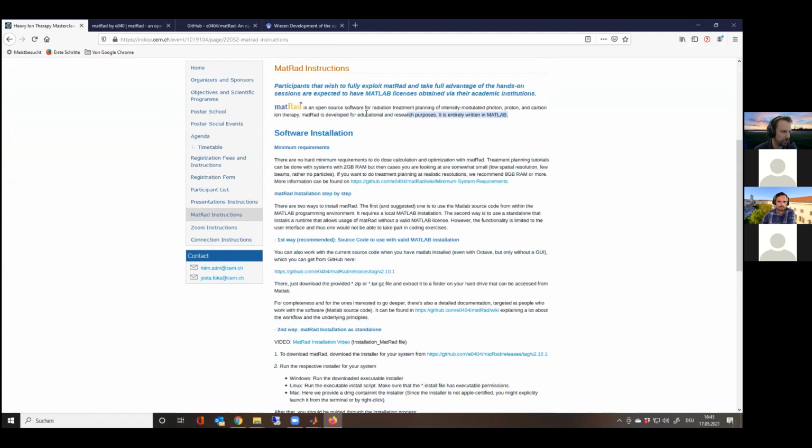This you basically know now. Here it writes in two sentences what I basically spent half an hour or more talking about. So I already touched on the minimum requirements. There are no hard minimum requirements, but treatment planning is a difficult and computationally expensive problem. It's not a small problem. It's not like getting scikit-learn from Python and training a very small problem with 100 data points or something like this, which people can do with machine learning all the time on their home systems now.